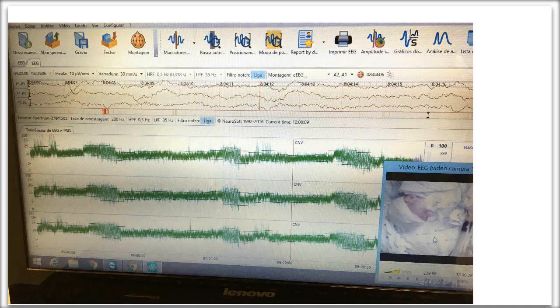I can't remember if you said he was on high frequency, but it looks like he's intubated in this image, which could also cause a drift of the margins if he was having some background artifact. Could definitely pull that up. I don't see a ton of artifact in the EEG snapshot that you sent, so I'm less worried about that.